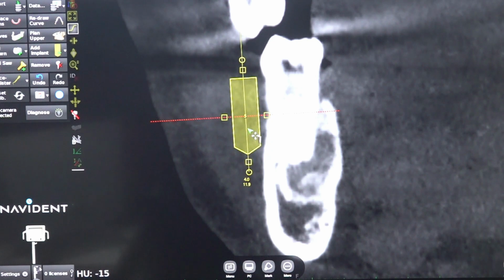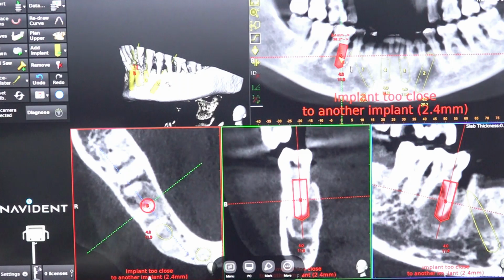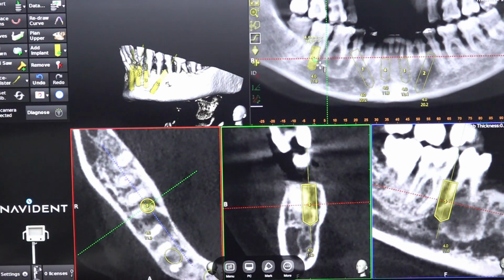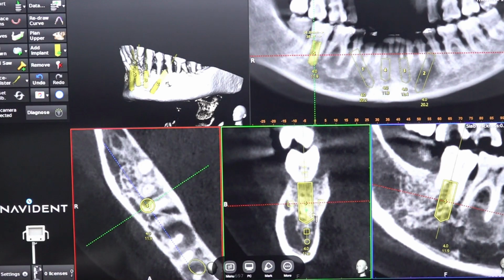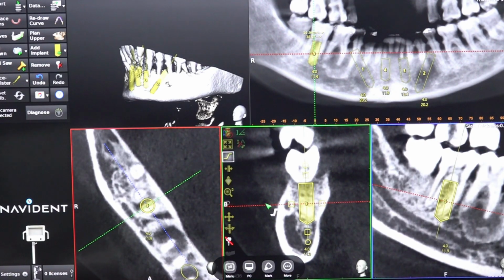And there is root resorption also. So we will see the distal root. Distal root is quite okay. And if you see here, the roots are divergent. But it won't create difficulty during extraction because there is a huge cyst in the root. So better to go towards the 7 area. So in the 7 interdental area we can place along the lingual wall. There is good bone there, 8 mm, 10 mm, even a 10 mm implant we can place.